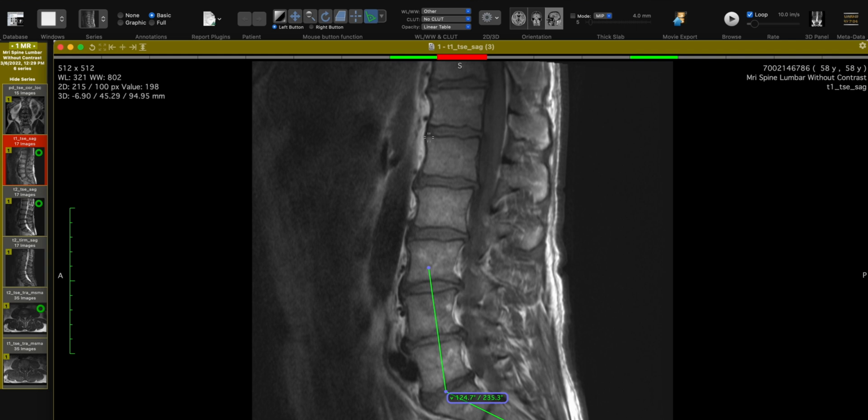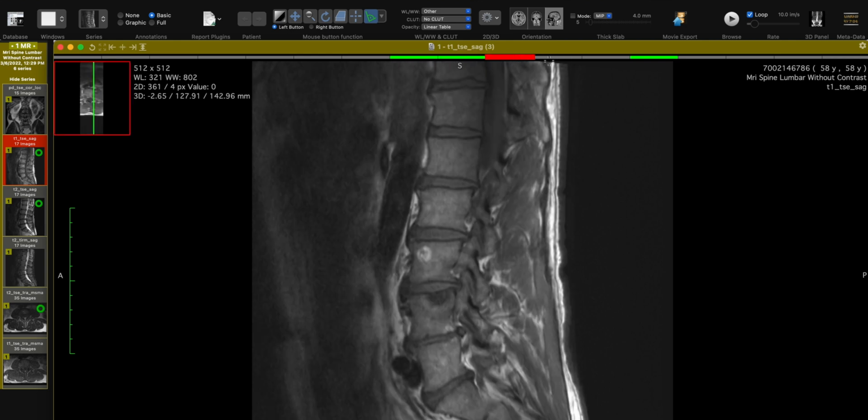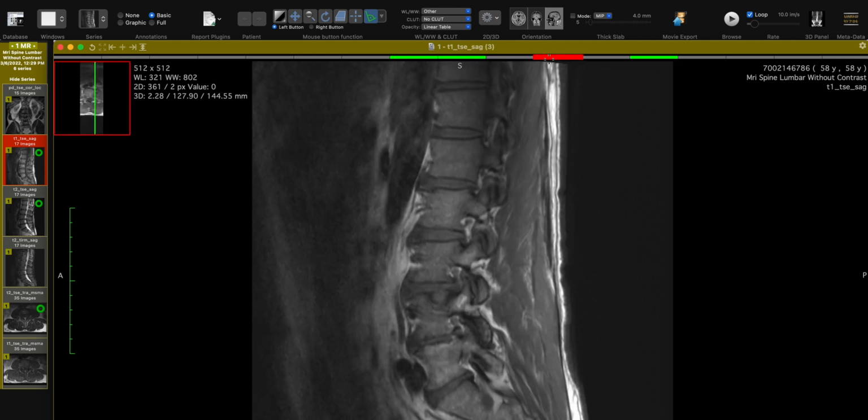There is a very, very straight thoracic spine. So up here, there should be a little bit more of a curve going into this curve, but his is just very flat, like what we call military posture. So we're going down. Again, we won't look at the nerves too much. This is just looking at structure.